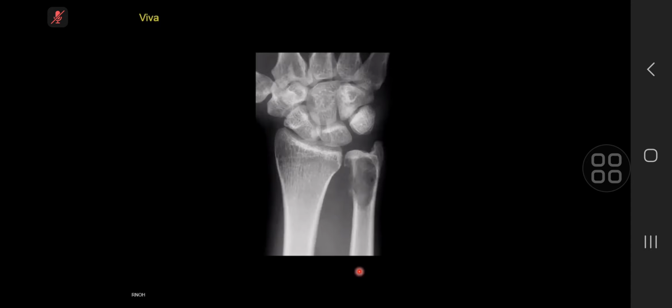Yeah, I think those are the most pertinent findings. Just looking at the rest of the radiograph, I can't see any other similar appearing lesions. So in summary, there is a lucent lesion in the distal ulna with overall, I would say, aggressive features, although there is a narrow zone of transition.